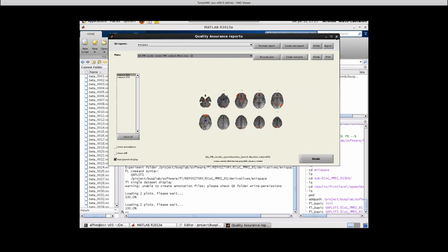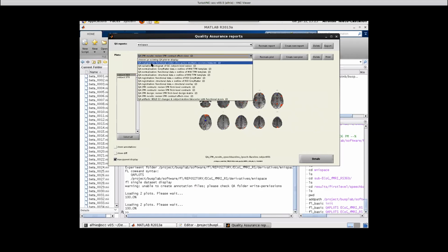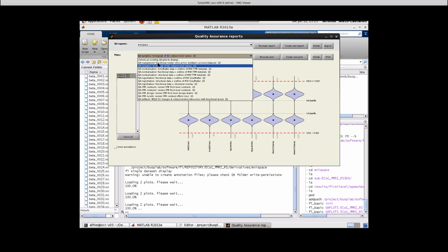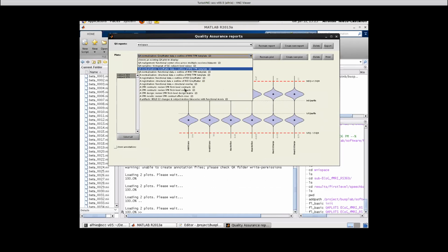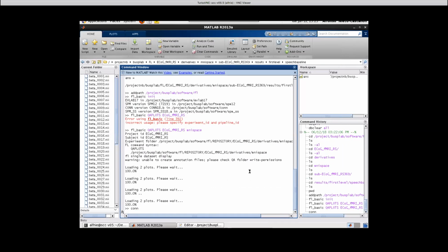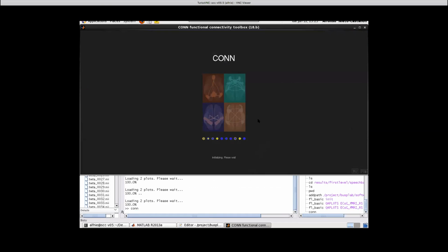Well, those look, I mean, not promising, but it's one subject. Yeah, but I also was using what was already segmented as baseline by earlier analyses. So I need to make sure that actually is baseline. I read the script, but I'm kind of like, okay, well, I'm not really sure what is used as baseline.